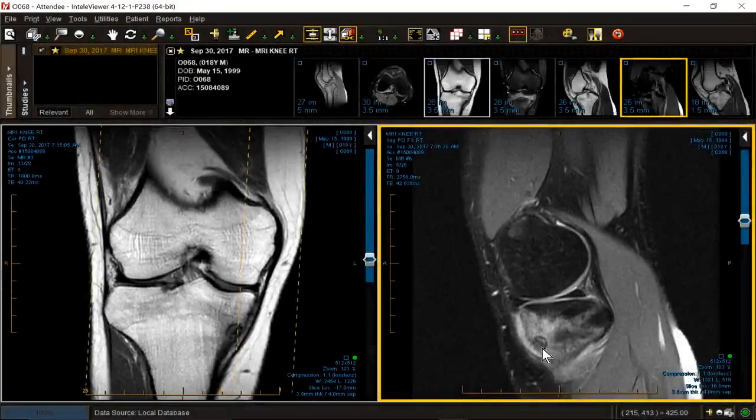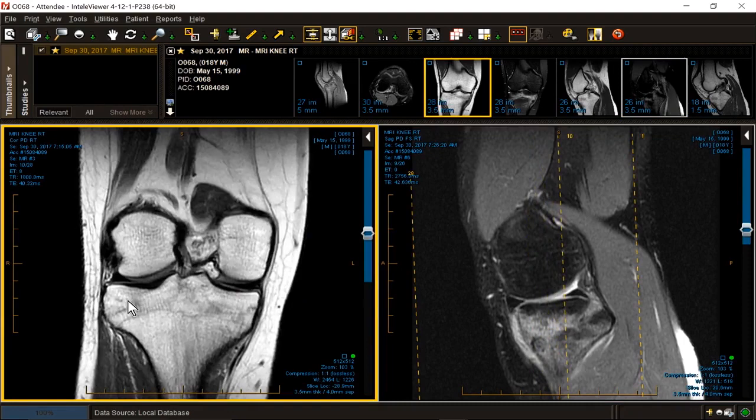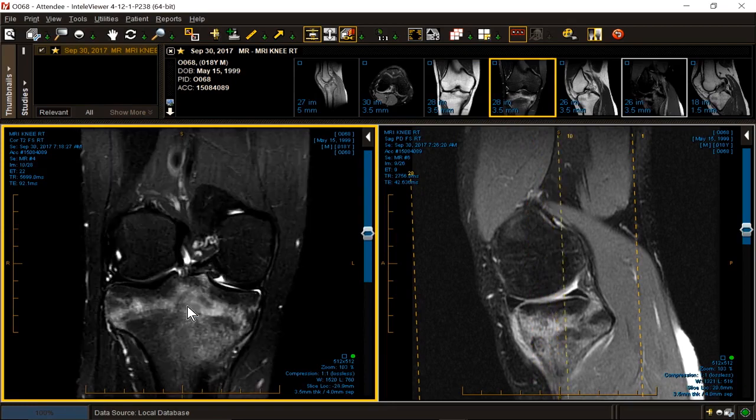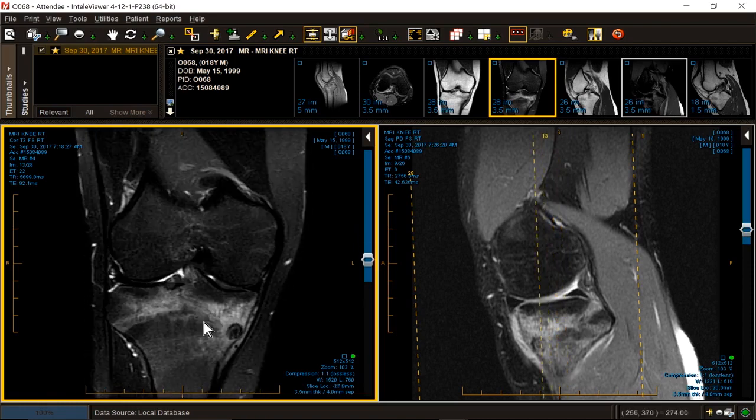We said our nidus in an osteoid osteoma should be cloudy. Well, we don't have an X-ray, but it should be gray or dark, not bright like the matrix of cartilage. This is gray or cloudy like osteoid matrix. It'll have a rim of low signal, and it'll oft have extensive edema, and this one does. Now, can I absolutely swear to you that these outer areas of edema are not related to trauma and related to our osteoid osteoma? No, I can't. I don't know the answer to that. But the medial edema is related to this lesion.